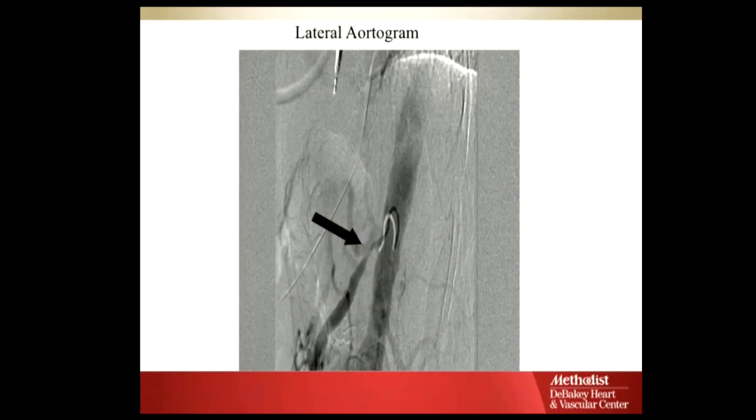And so this is a reverse curve catheter. Okay? So sometimes if you have a downward projecting target vessel, and you come up with a catheter shaped like this, you try to put a wire up there, and it just backs the whole thing right up. So what's been done here is you've got to reshape this catheter. The problem is that the diameter of that is too big for it to reform inside this artery. It goes in straight over a wire, you pull the wire back, and it goes like this. And you really want it to go like that.